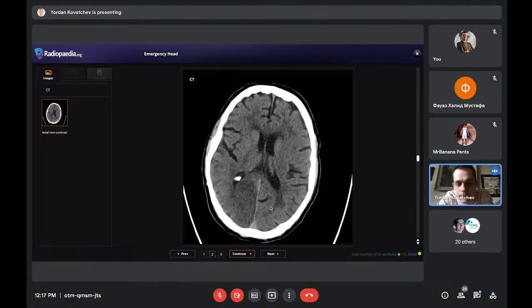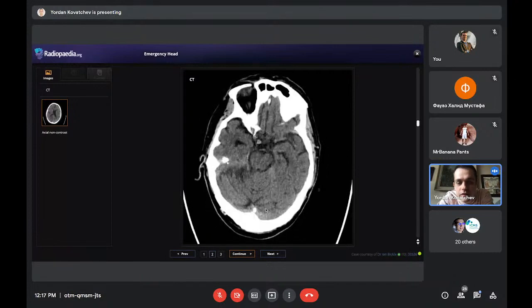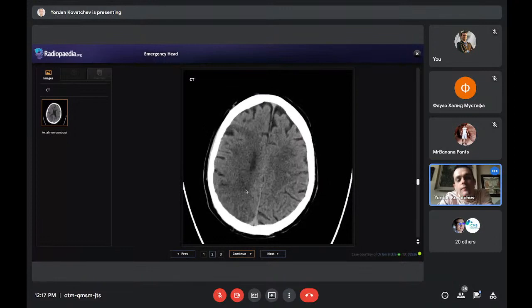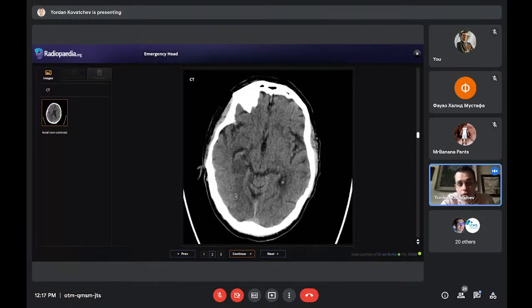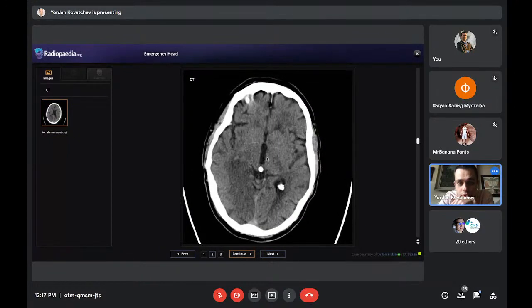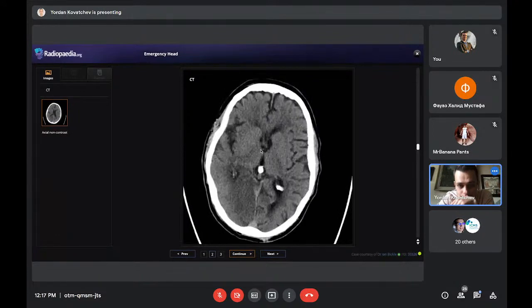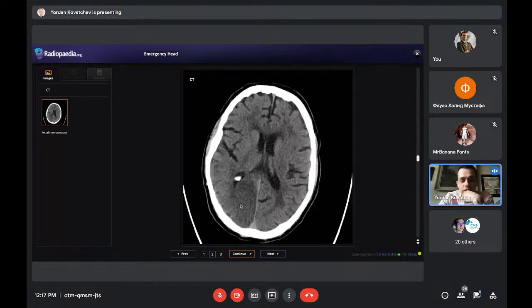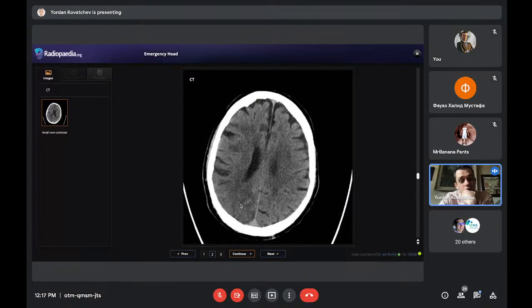In the right occipital lobe, on the left, it seems fine, which means that there is probably, or there's definitely, an infarction going on. That's probably a thrombus in the posterior cerebral artery. Because if you remember earlier, when I showed you the vascular territories, this is the vascular territory of the posterior cerebral artery. Let's see if we can see it, but it will be really hard. No, it's hard to see it on the non-contrast CT.